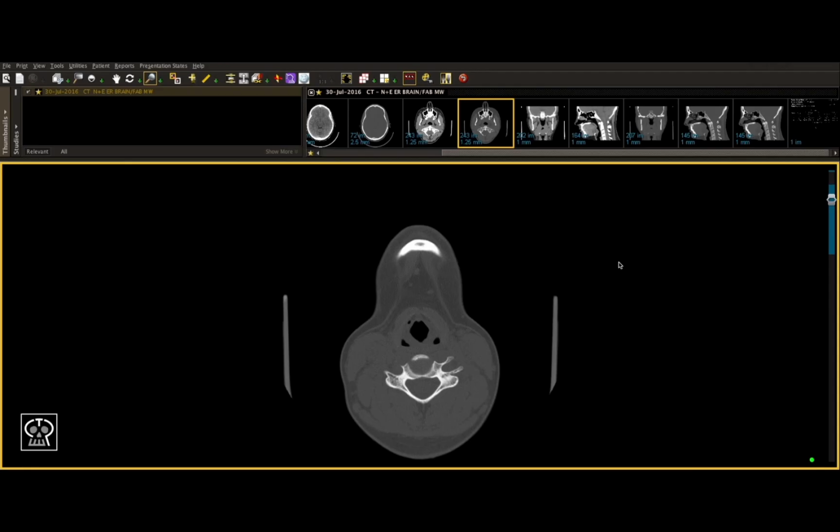the millimeter thickness. For the purposes of this course, we'll always be looking at CT facial bone scans, and these are dedicated CT scans of the face so you can analyze the facial bones and soft tissues. It's what you'll always want to use to analyze for facial fractures.